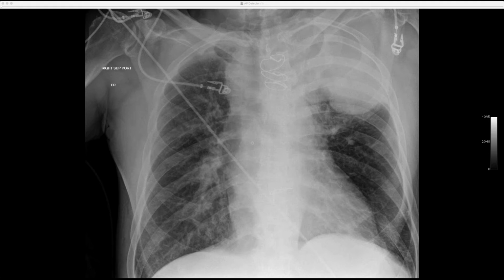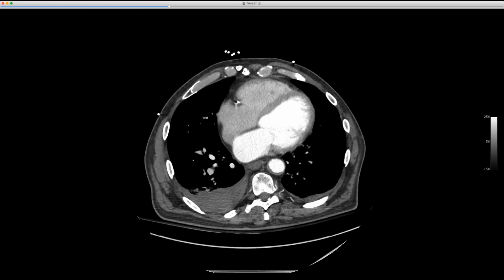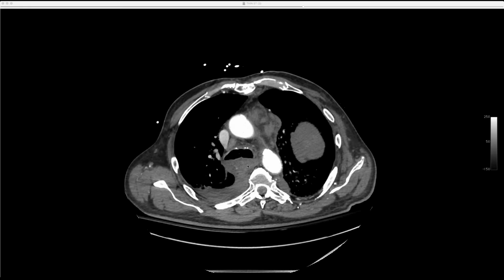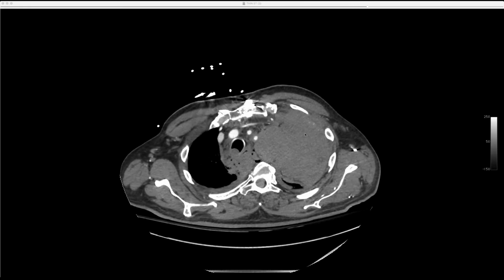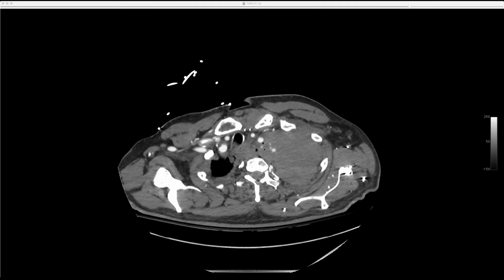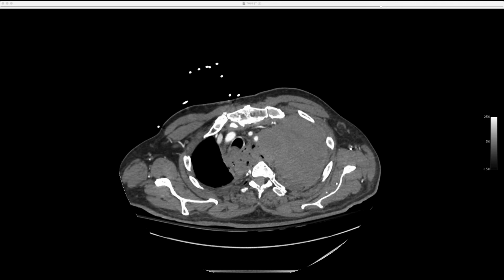And what's odd about him, and let me pull up his initial CT, is you can see he had a hemothorax on the right, and you don't see it. There we go. You have a hemothorax on the right, a hemothorax on the left, and there's mediastinal blood and a little stranding anteriorly, but this huge extrapleural hematoma that seems to be arising probably from a subclavian or subclavian branch. There's this extravasation in this area. But what's odd is he's got all this gas in the mediastinum.